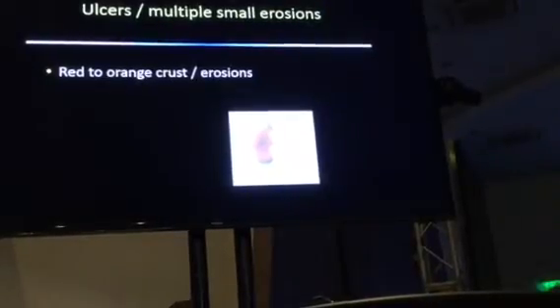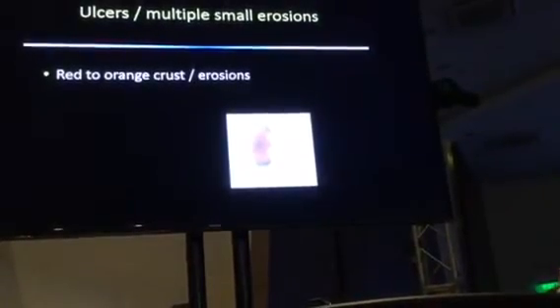So the last category are the non-pigmented flat basal cell carcinomas. Often these are the most challenging to identify, and the reason why many of the early dermoscopy studies didn't really incorporate this category. Here, for me, the most important structures are multiple erosions, short fine vessels, and shiny white structures. So, multiple erosions. These are red-orange crusted erosions.